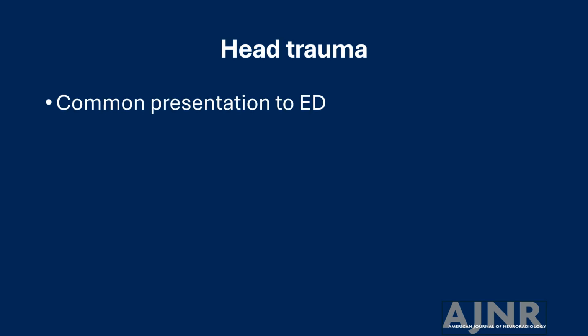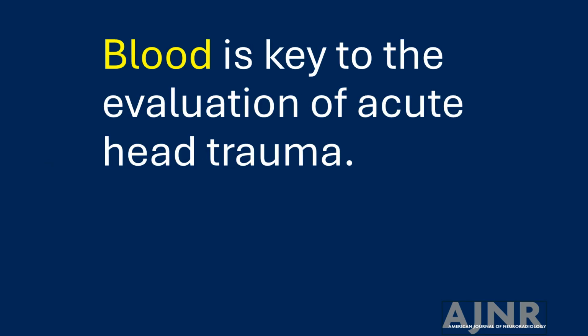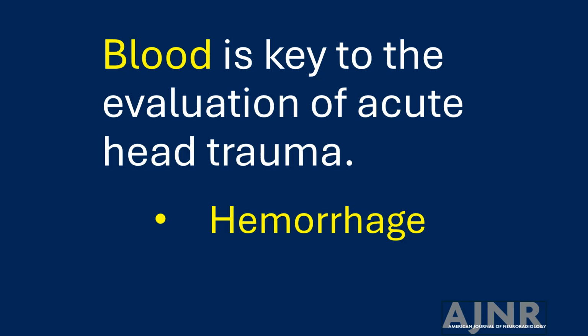Head trauma is an extremely common presentation to the emergency room, and CT is critical for evaluation. Blood is key to the evaluation of acute head trauma, and in this presentation, we will discuss hemorrhage as well as vessels.